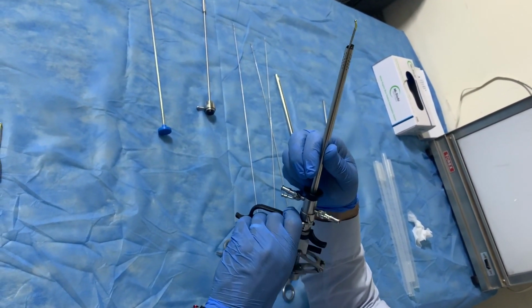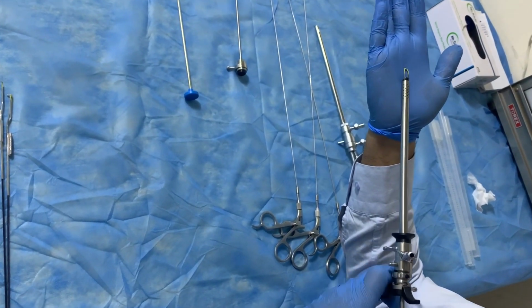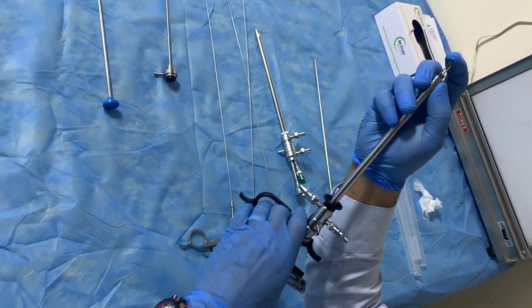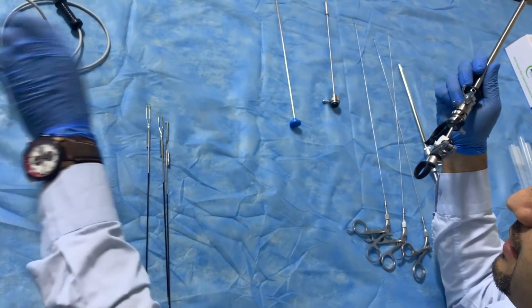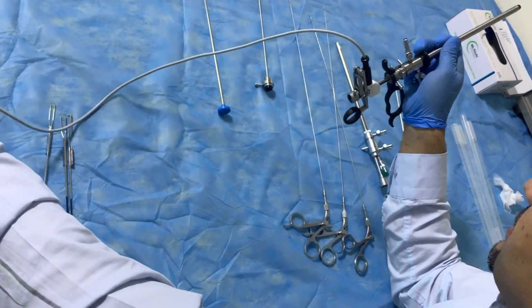This is called active, not passive. If we want to do some work, just press on it and cutting the tissue. Suppose this is the tissue. And you connect electrode. How we connect electrode? A current from here. And this connect for monopolar system.